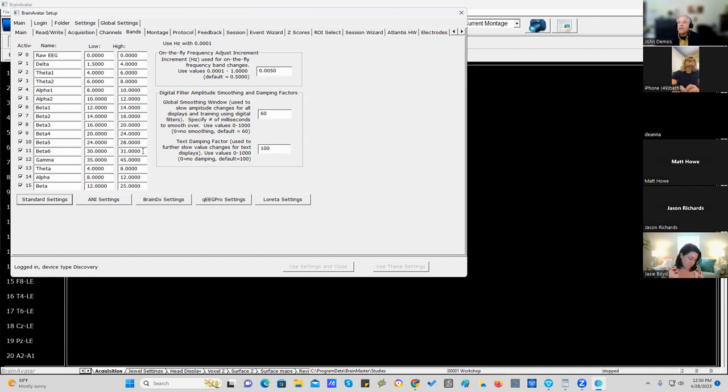Now, dampen does not mean fix. This means that the majority of sites that have EMG will be identified and will be dampened, and your report will be much more accurate. On the other hand, if you have 5 or 6 sites with EMG, first of all, you can't dampen it because we don't have enough good data to base our dampening on. And second of all, it means your recording is very poor. All right, so that's the reason for that.